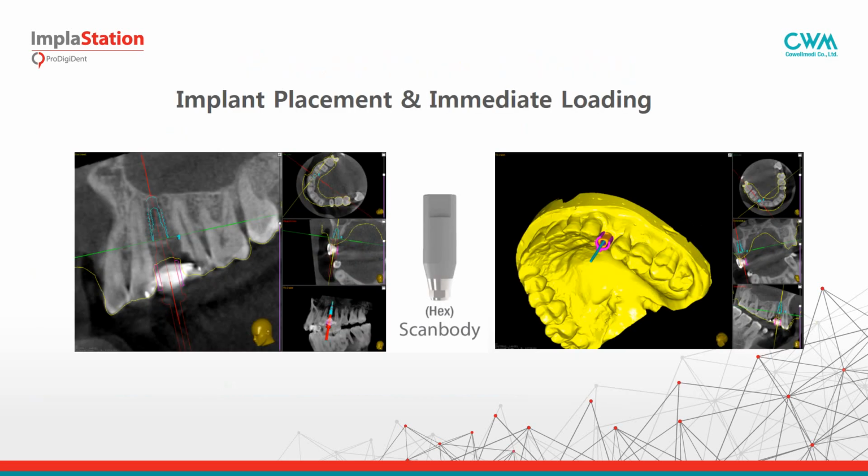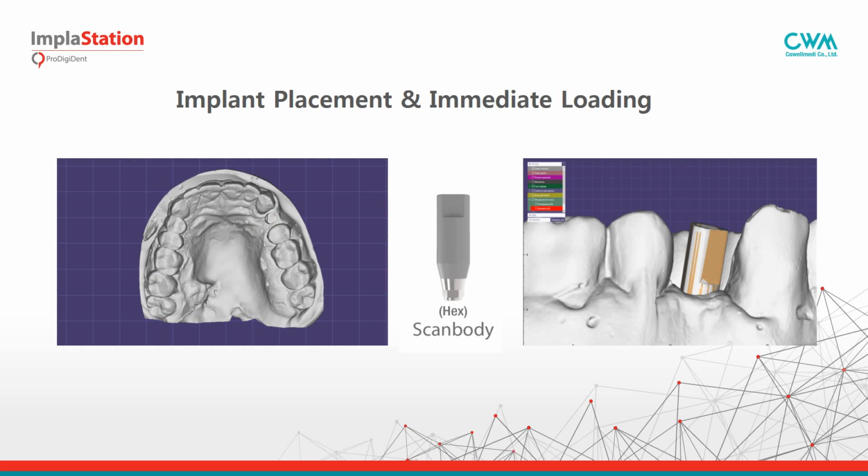Immediate loading case. You see the planned position of the implant, the virtual scan abutment attached to it, then the initial STL surface exported from the project together with the scan abutment. This is how dental technicians see it in the CAD software. CAD software can recognize the scan body and inserts the implant analog at the proper position.